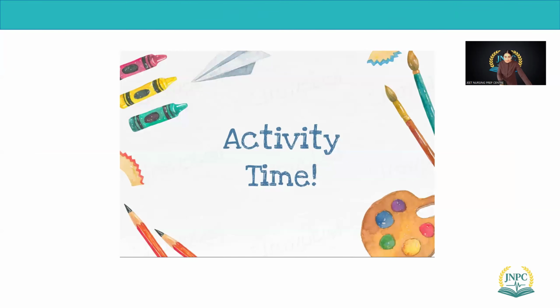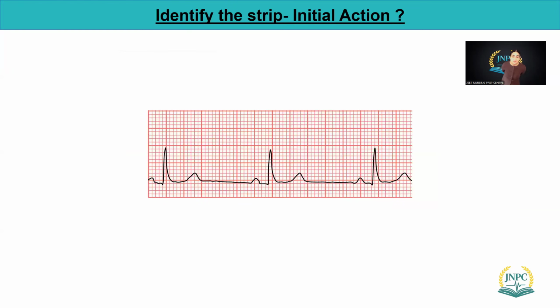Okay, so it's activity time. What do you think about this rhythm? What is happening here? Be fast. Let me see. CPR? Do we do that? No, that's a previous step.